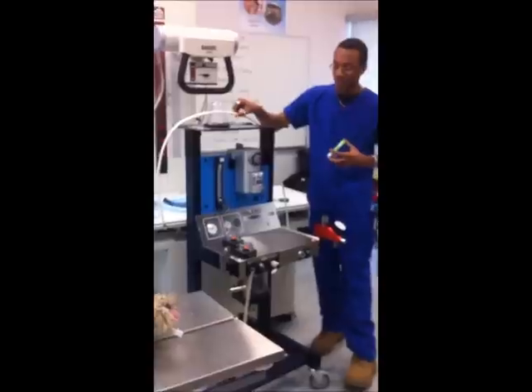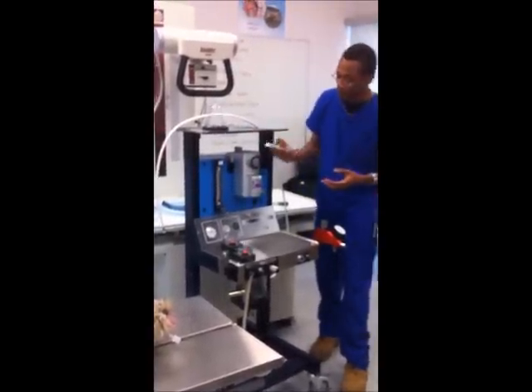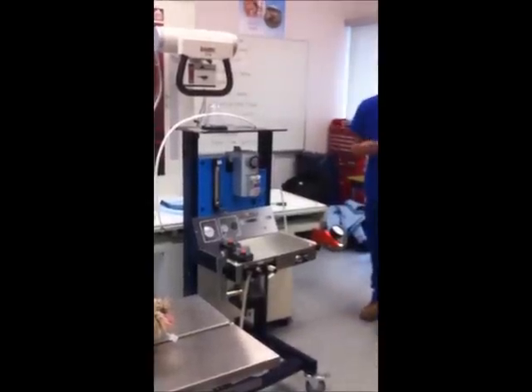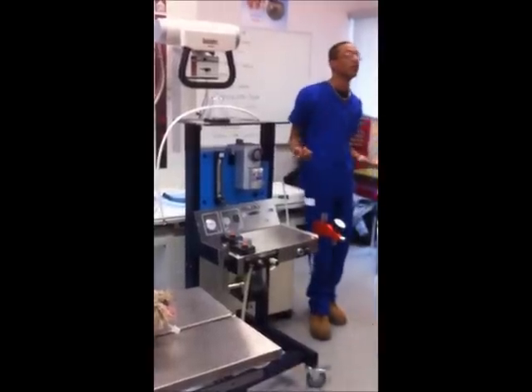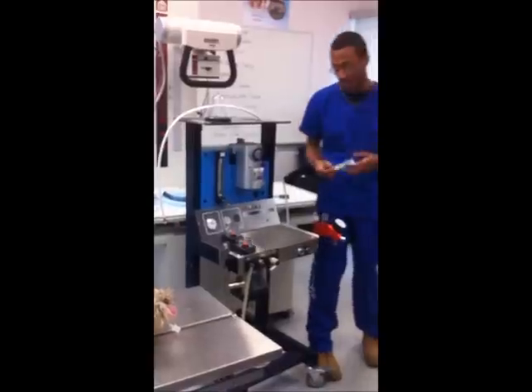Okay, so from your oxygen to your flow meter, oxygen measured in liters per minute, to your vaporizer, anesthetic gas is measured in a percentage. Good. So now your whole kitchen concoction is made up. These 2 gases are mixed. And what is it called? Fresh gas. Oxygen and anesthetic is called fresh gas.